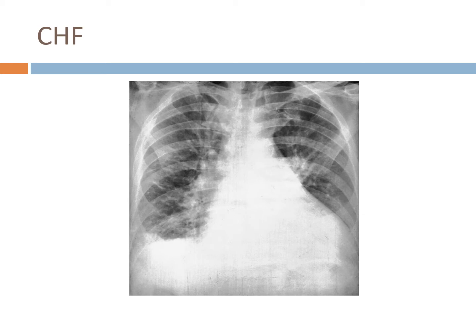They are basically pleural lymphatic vessels that are filled with fluid. They're generally very subtle and often hard to see on an image.